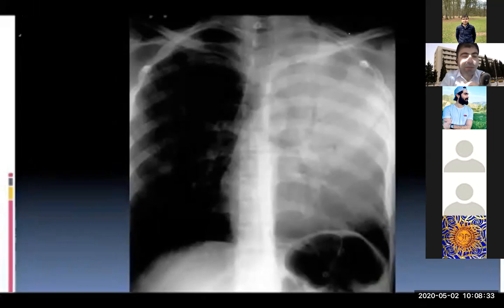So in this case, there is opacification on the right or the left lung region. So there is air bronchogram. So just to know that this is air bronchogram. You will not see it normally, and on this, because there is opacification of all the lung, and there is air, the bronchial system still has air. So there will be air bronchogram.